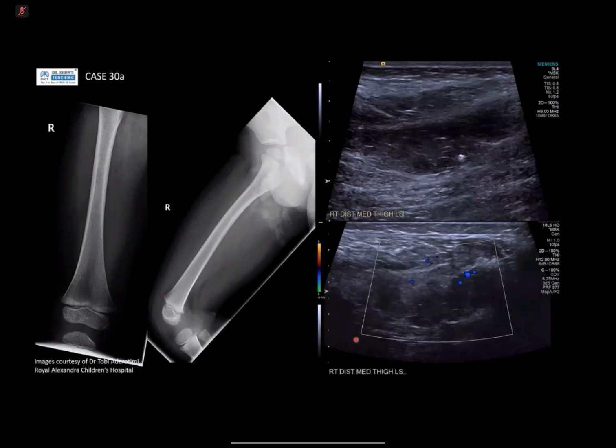This could be a calcified lesion like a soft tissue neoplasm. There's no involvement of the underlying bone. Okay, so I'll give you more history. There is not much in the way of soft tissue changes, but Mom says when the patient is particularly active, using the limb a little more, you notice the swelling gets bigger, and then it goes back down in size.